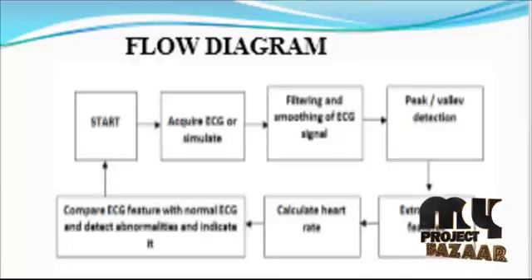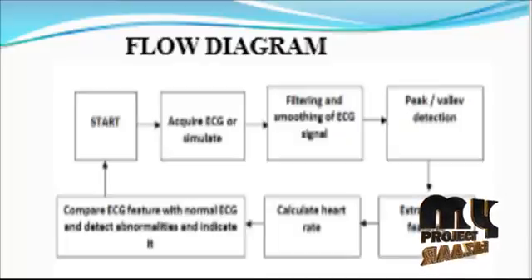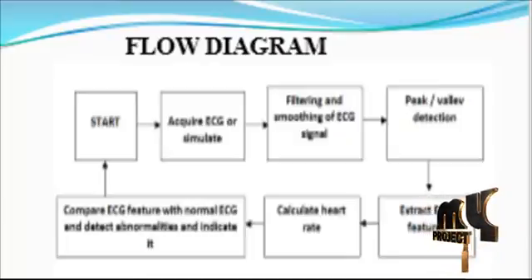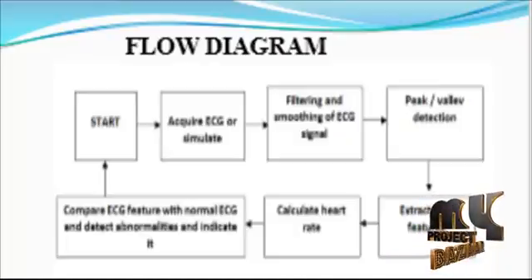After the heart rate calculation is done, the signal is passed through to the disease detection model, which compares the ECG parameters with the normal parameters according to some specified rules and indicates the disease on the front panel of the virtual instrument. The processed signals are simultaneously displayed on the front panel as the result of each step performed by the designed virtual instrument. After that, the program loops to the first stage, collects the next data, and repeats the above process up to the length of the prediction period.